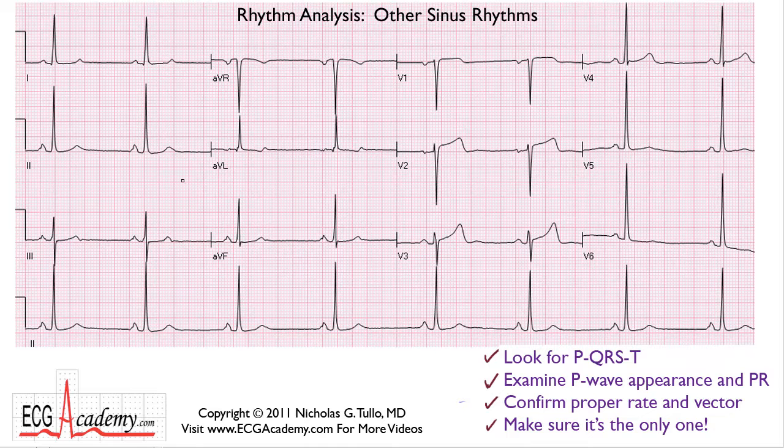So we'll look at this cardiogram right here. If you look at lead 2, you see a very generous P-wave, a QRS complex that looks pretty large, and we'll get into how to diagnose abnormally high voltage in the 12-lead course. The T wave looks appropriate. The QT interval seems reasonable. It's less than 1/2 the R to R interval.